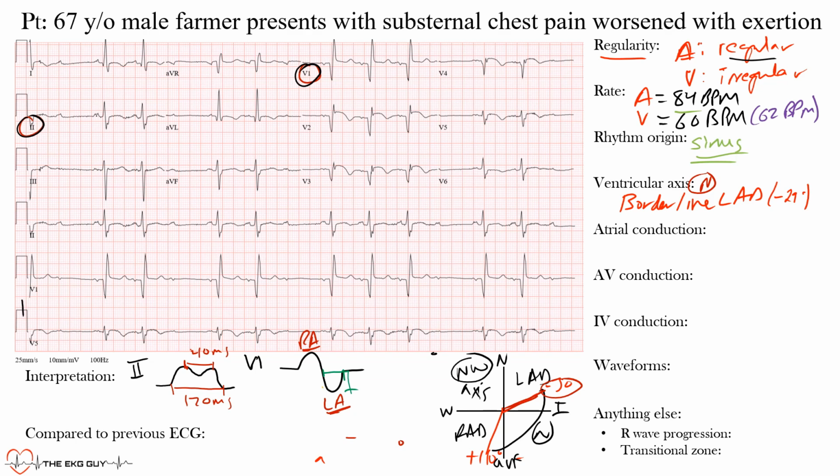And if you were to measure them out, you'd actually see some of that notching there, okay? Maybe you could see it better down in these leads. Hard to make out if you're not zooming in, but if you trust me, it is there. So we do have evidence of left atrial enlargement, okay? And in lead 2, the reason it is prolonged is because, remember, the terminal portion is the left atrium, and it'll push it this way. For right atrial enlargement, you're going to see peaking of these P waves in the inferior leads.